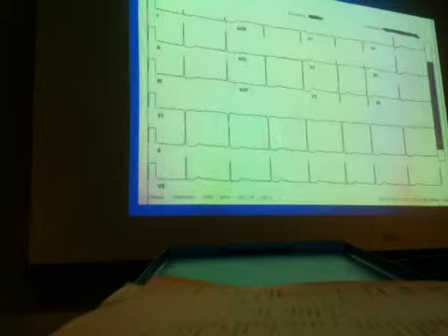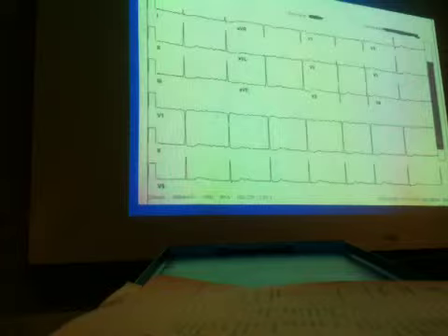First impression, oh, difficult to see without having a way to measure it out. I can tell you that it's irregular. Do we have P waves? Can you discern a P wave in front of every QRS? We can say there are P waves everywhere. No?